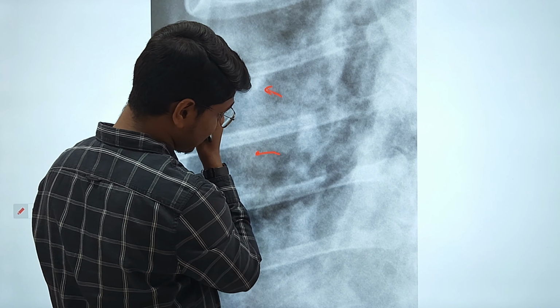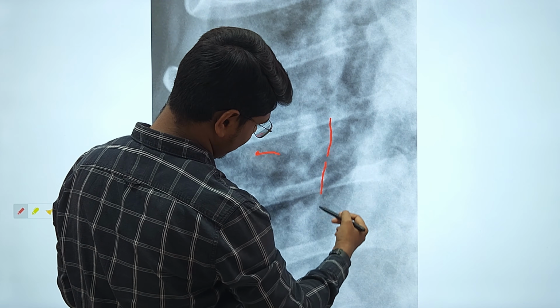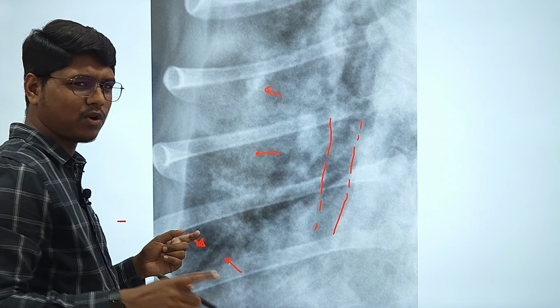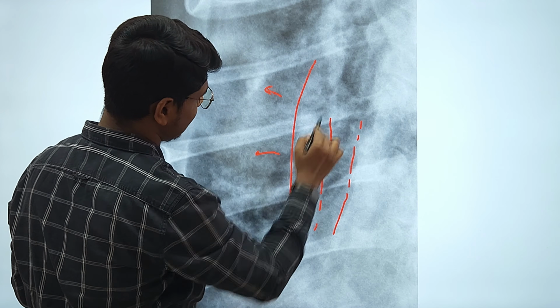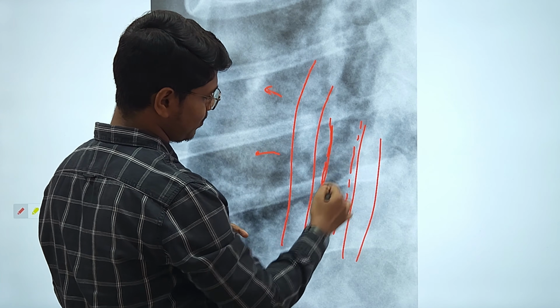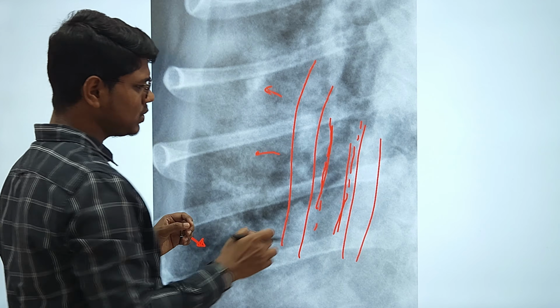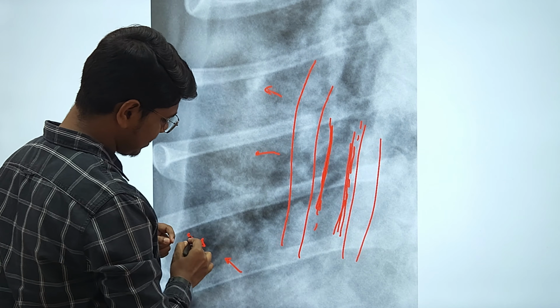Another thing, let me highlight for you. Can you see here? This is a bronchus, but it is not an air bronchogram, because here is a vessel actually. There is one vessel, and another vessel. These are caudal pulmonary vessels. Between those pulmonary vessels, you will find the bronchus, which is basically normal. The differential diagnosis is especially for the tram lines.